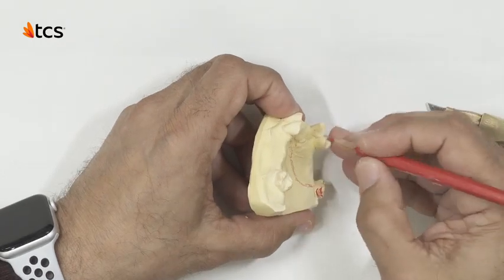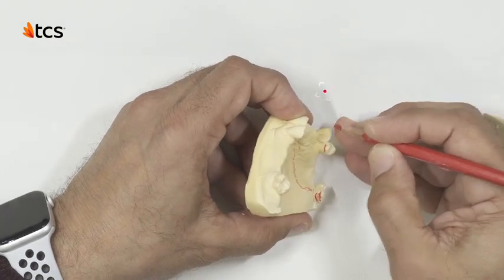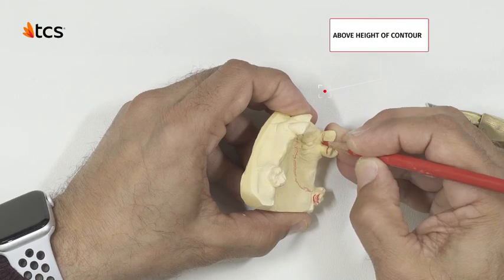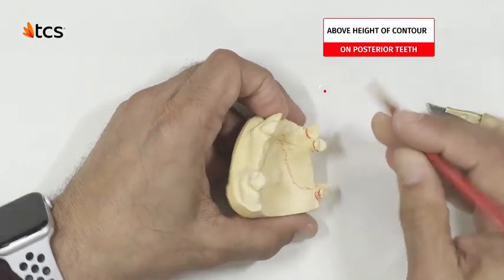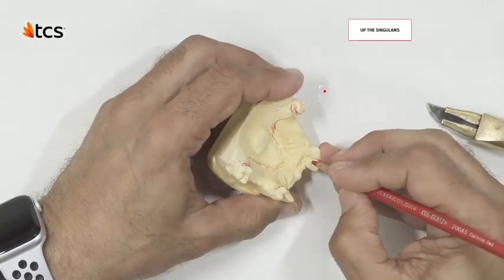A standard rule when designing the lingual portion of the abutment teeth is to go above the height of contour on the posterior teeth and to the cingulums on the anterior teeth.